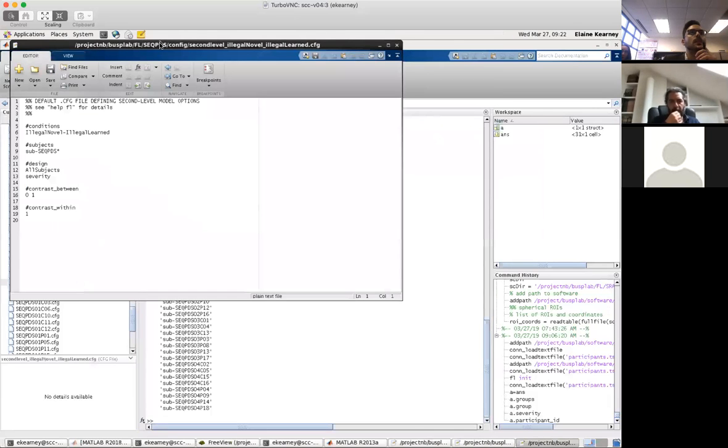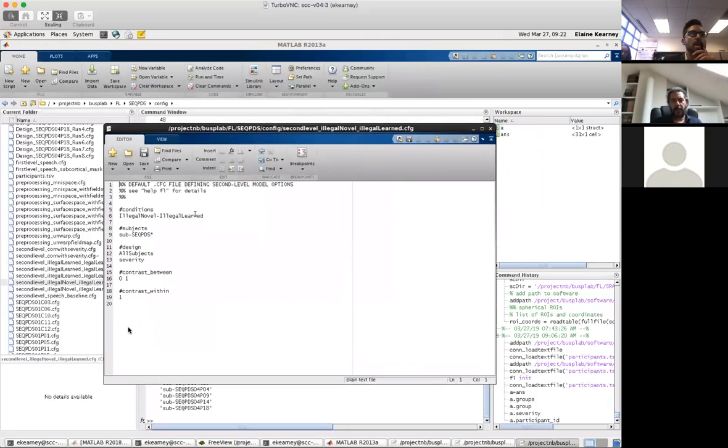But you can leave it there as well. I mean, it doesn't change anything. I'm just saying. So if I just want to examine if this contrast in activation is characteristic at the population level for all speakers, both stuttering and non-stuttering alike, I don't include severity. But if I want to see whether this contrast activation is attested at the group level for stuttering speakers, then I include severity, and it will only do it for the stuttering speakers. So this is looking at that particular correlation between severity and the activation.